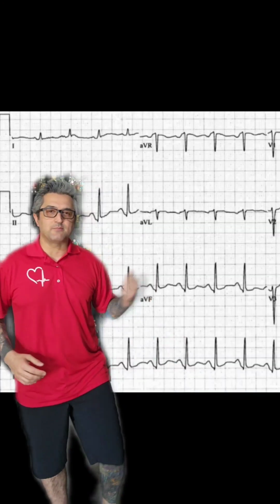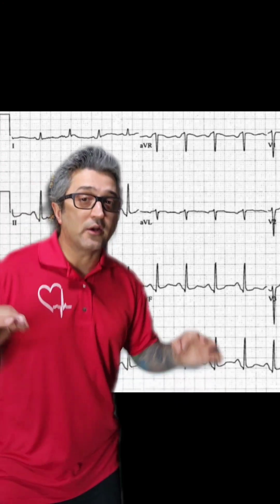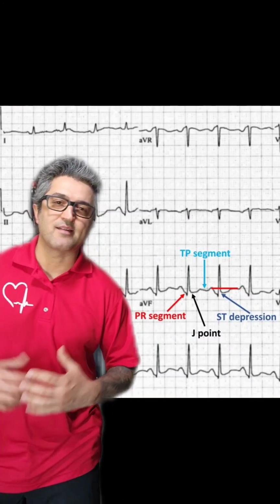And one last example. Take a look at this ECG over here. Do you see ST segment elevation or depression? Well, let's locate our TP segment and find out. What we have here is ST segment depression.